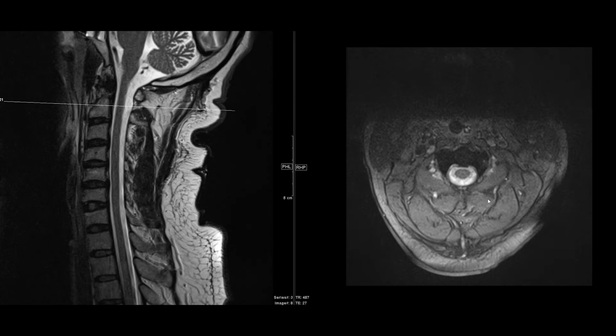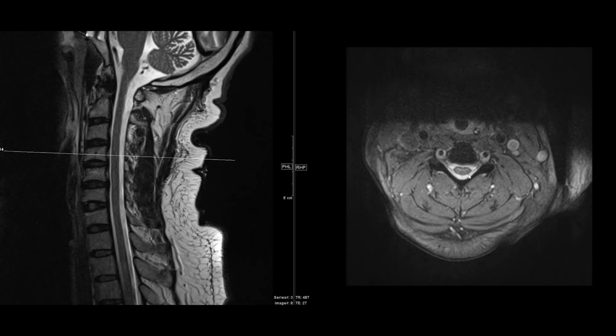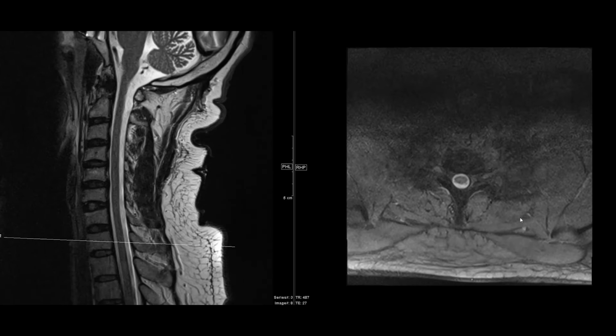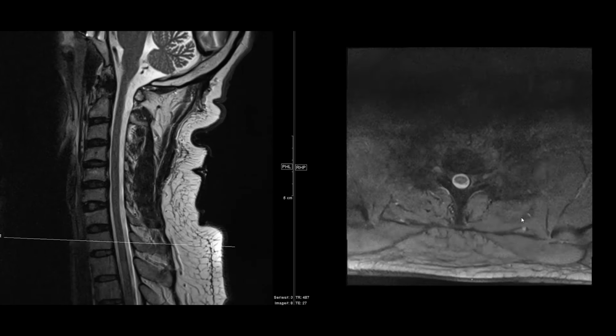So you take a look at the spinal cord here, see if there are any areas of abnormal susceptibility. Again, you see a little bit of that horn architecture within the spinal cord itself, but we don't see any areas of abnormal dark signal there, which could be blood or calcium, so we don't see any of that. Next, we'll move on to the soft tissues.